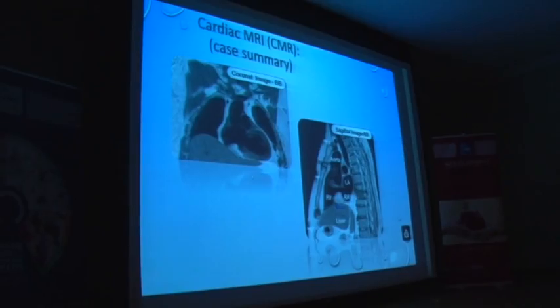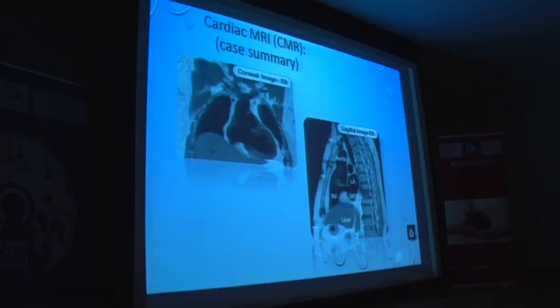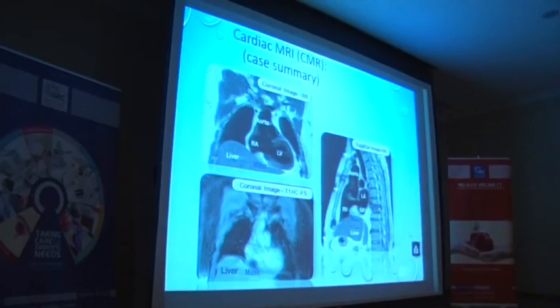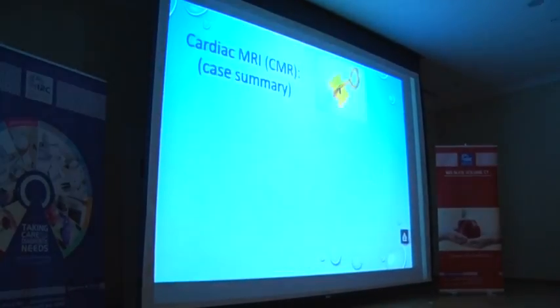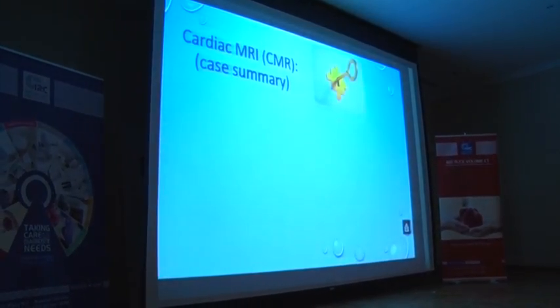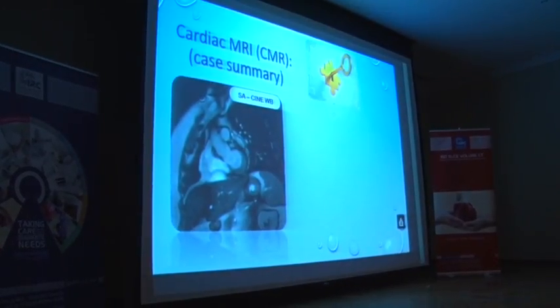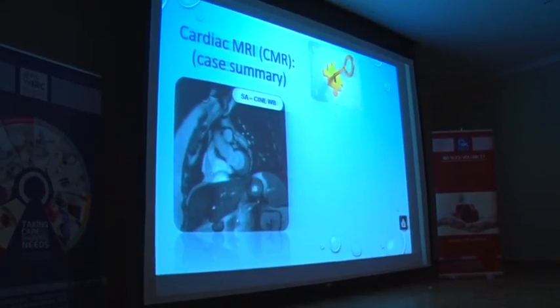We injected contrast, and you can see that this lesion didn't take the contrast. Didn't take the contrast, okay? Pericardial, no. Then take care, because everybody will get it now. This is the key image. The key image is fat suppression. So these are the cine white blood images, you can see the lesion is outside of the heart. You see how it is?